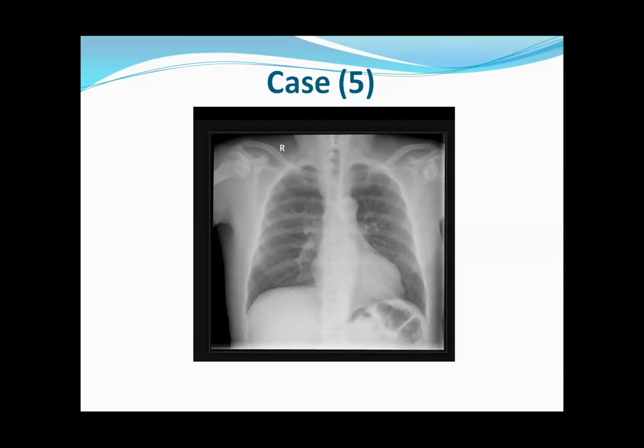I'm looking for any causes of chest pain. There is no widening of the mediastinum as such. You should check your review areas. The apex, hila, the supra and infradiaphragmatic margins all appear to be normal. In the upper abdomen, the splenic shadow is not well visualized.